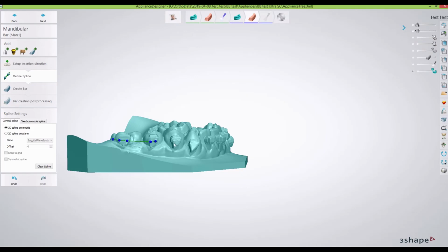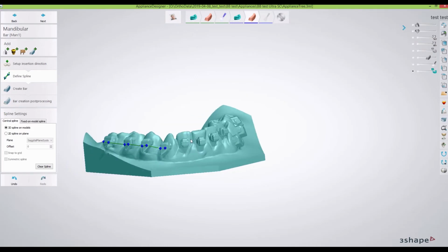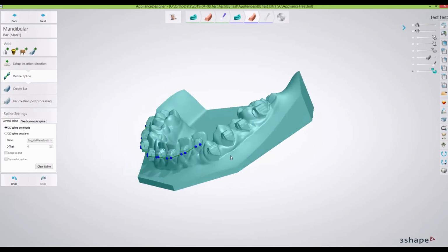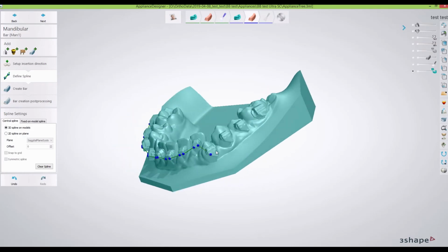Some people will do just one point on a bracket. I like to do two, and just don't go in between the teeth. You're going to end up with one really flimsy shell. And again, when you're picking which technique you're using, 0 shells, 1 bar.